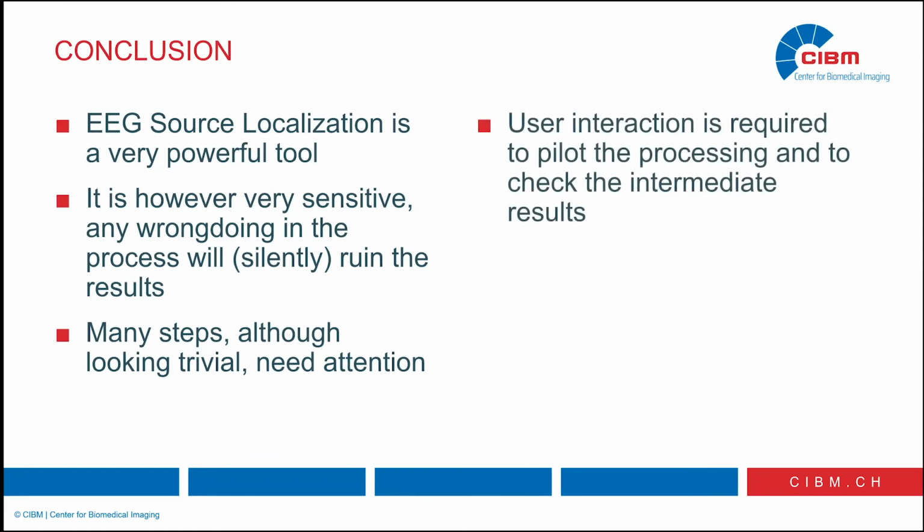And the very important thing is that during these steps, the user must interact, first to pilot the toolbox, and also to check all the intermediate results. And of course, Cartool is there for you.